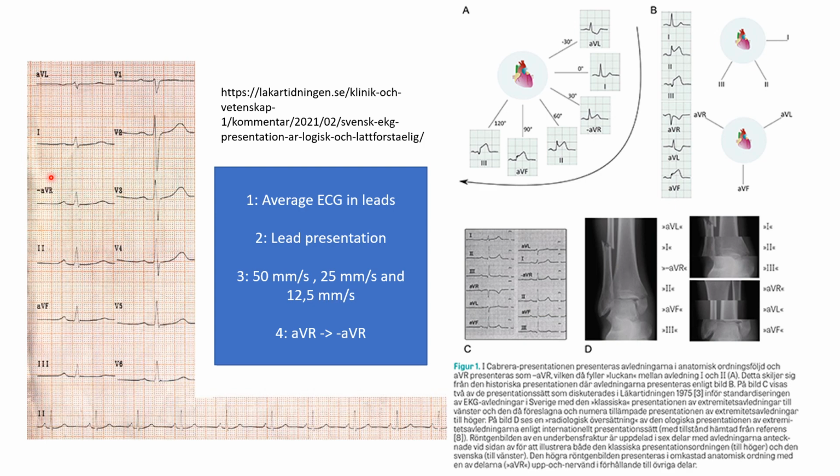And there's one OMI criterion, which is ST elevation in AVR and diffuse ST depression everywhere else. That becomes ST depression in minus AVR, and ST depression everywhere else. So there are some small things and gestalts that you need to switch if you can.